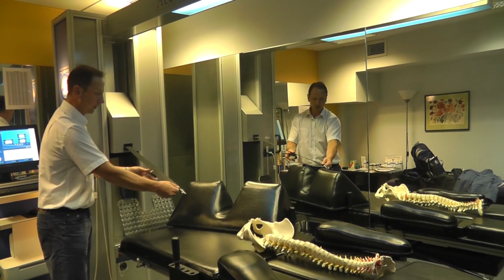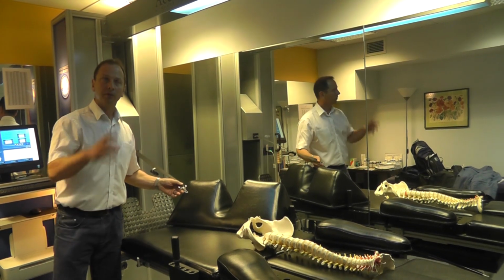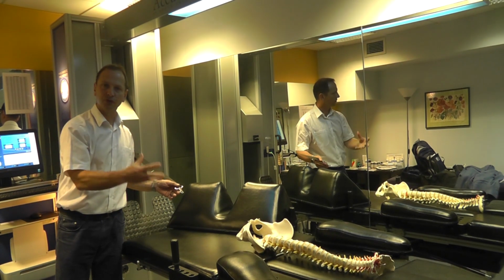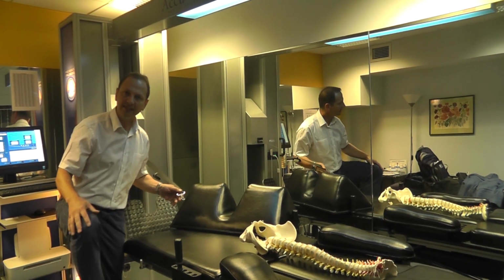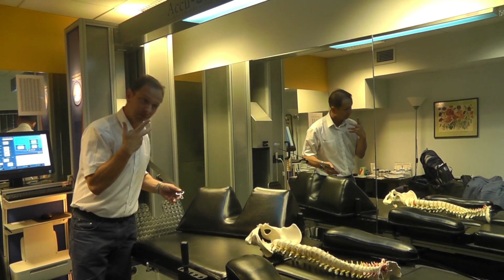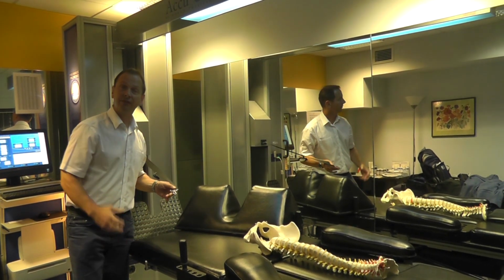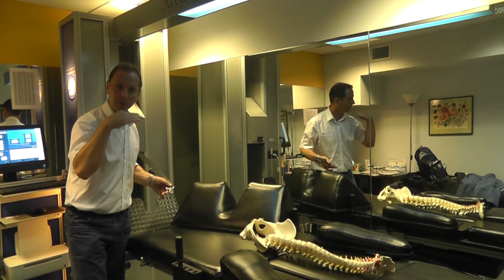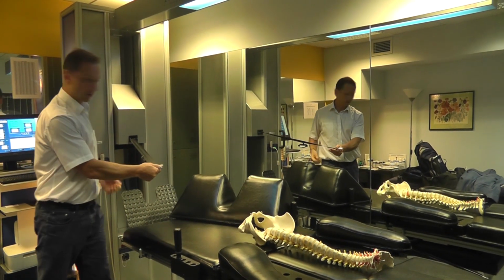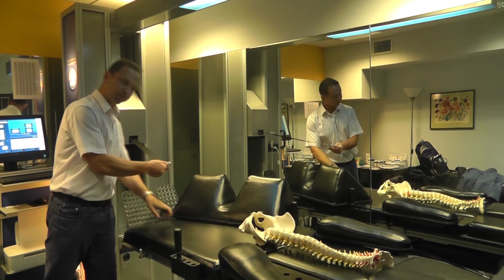Okay, so with traditional traction, the motor would tend to be in a fixed spot. People would use lifting knees up to different positions, but it wasn't precise. The treatment was developed with this question of how can we precisely focus treatment at a segment, and hence you have this sort of engineering solution.